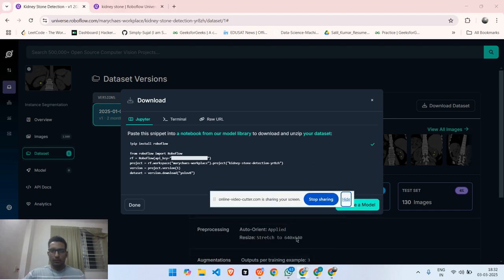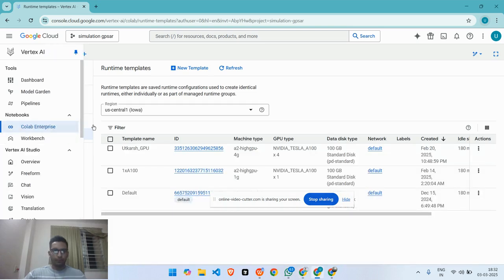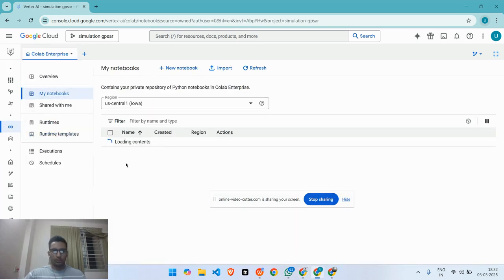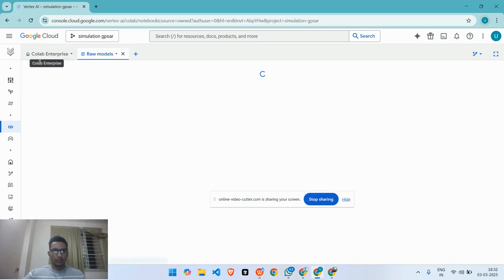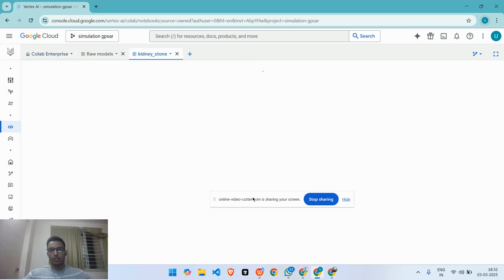Now I will switch the tab to show you the code. So, here's the project.